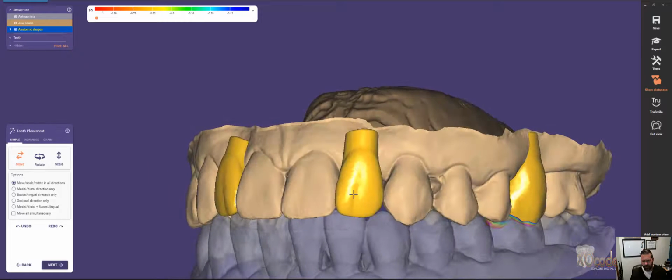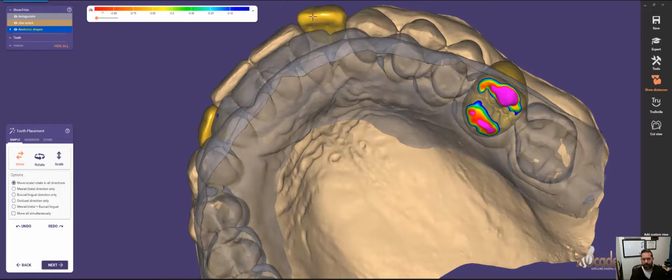These are for looks only. And we're just going to modify these around here.